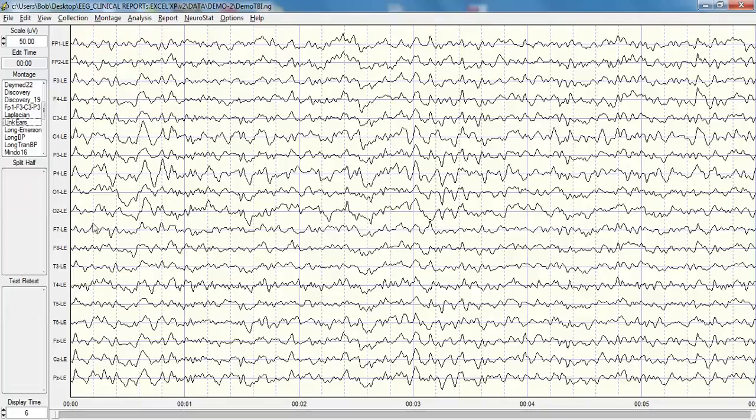In order to evaluate where inside the brain this event comes, we're going to use the LORETA Time Domain Capture tool, and we're going to expand the time base. Right now, this entire screen is 6 seconds of time. Each blue line is 1 second, and then there's 6 of them.